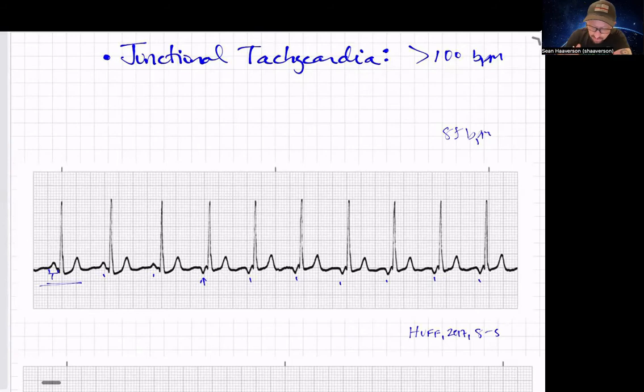So that looks good. But let's also take a look at one of these rhythms that has the inverted P wave right here, because it is technically a little bit different rhythm. And so that looks to me to be about 0.08, right? So 0.08 on this one, and this one's a little bit wider, so I think 0.12. Okay, and again, we do that because we have a different rhythm, so we need to look at these as well.